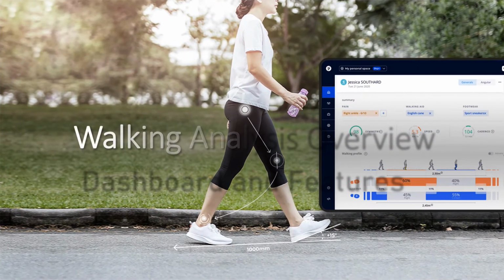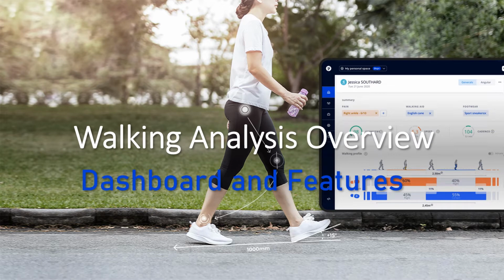So this is sort of a part 3 of the overview on the walking analysis. This will specifically cover the dashboard and some of the features that you're going to find within the app program online.